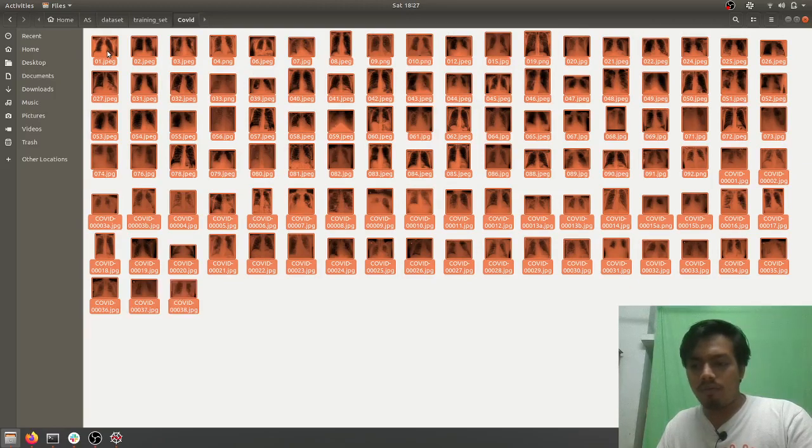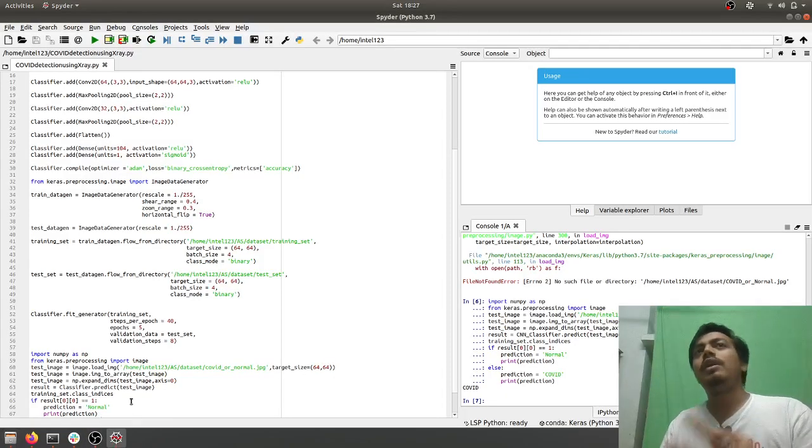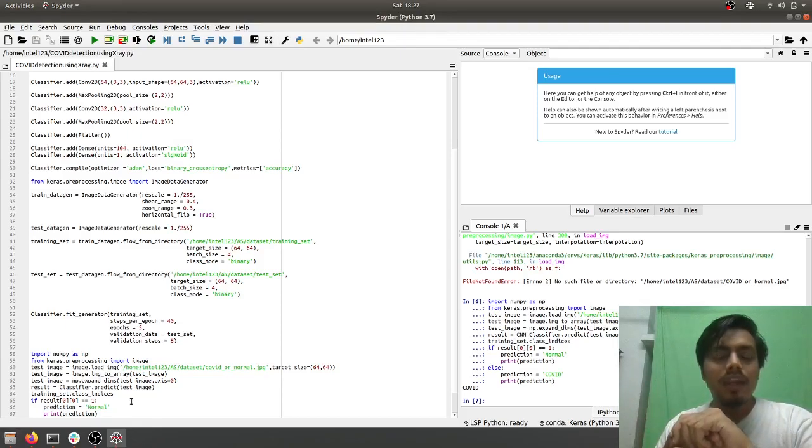We have around 101 and 71, around 10:7 roughly. The ratio is fine, but the quantity of the images is certainly less. Just showing your model 180 images, will it be in a state to get some good accuracies?